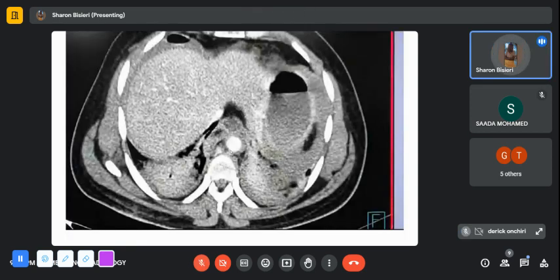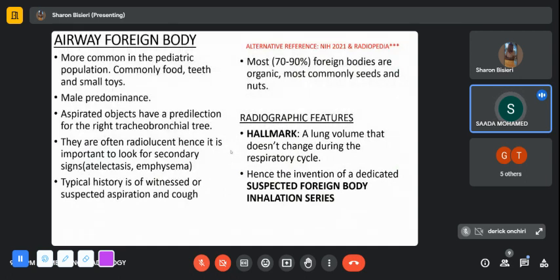I don't know about that unless I inquire more about the case. I have the 3D recon, I'll send it to the class. In the 3D, you could see the outer, posterior part of it being a bit injured, so it was better demonstrated on 3D. Yes, it was showing the external part of the aorta that was affected. That's true, and there was also some filling defect on the internal part.